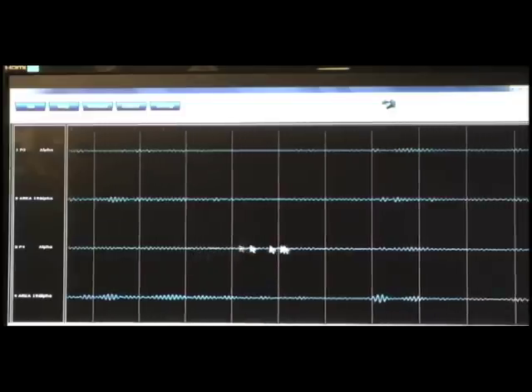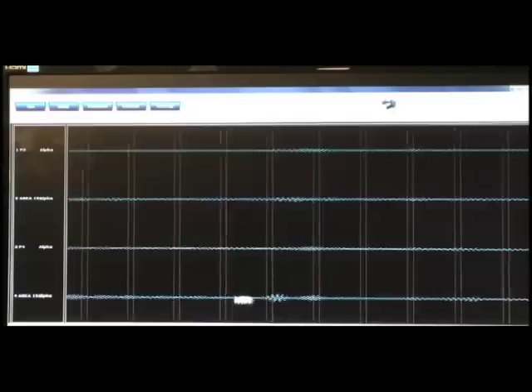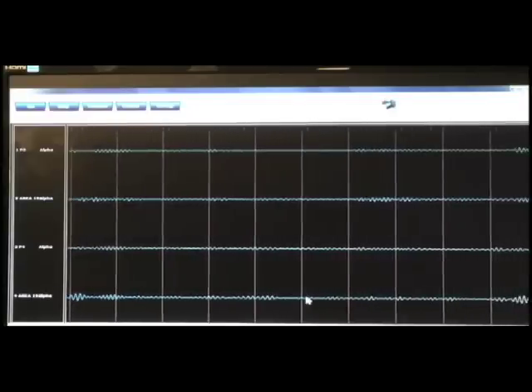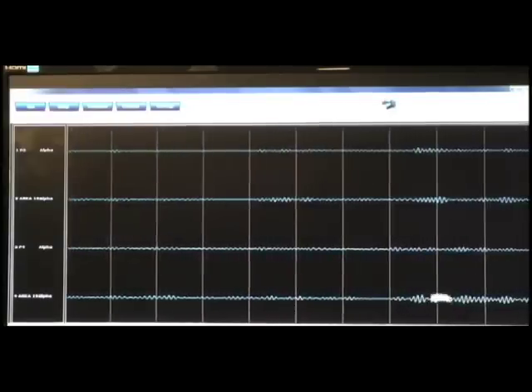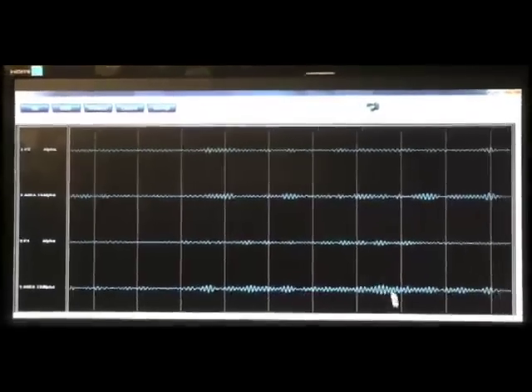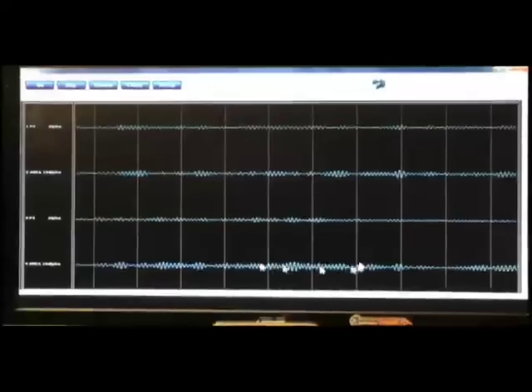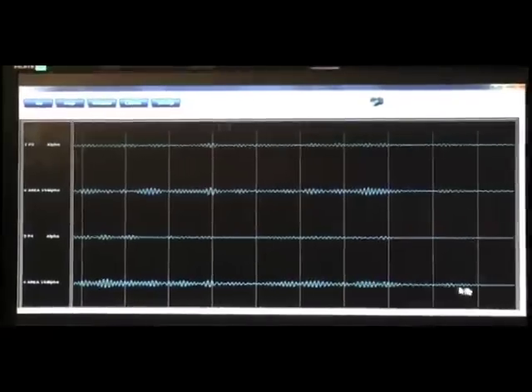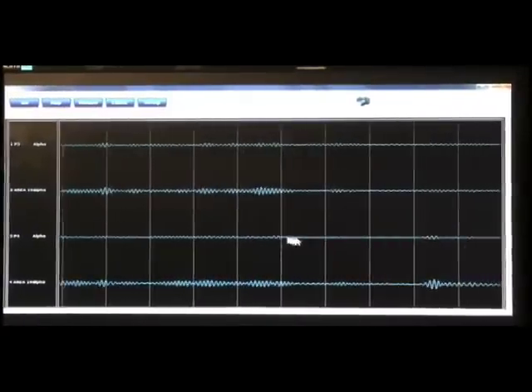Then channel 3 is P4, and channel 4 is area 19 on the right. And what we're looking for is more clarity of bursting here on channels 2 and 4, and we see that here. Very much on channel 4, we see that often it's giving bursting activity when it's not that evident in P4.